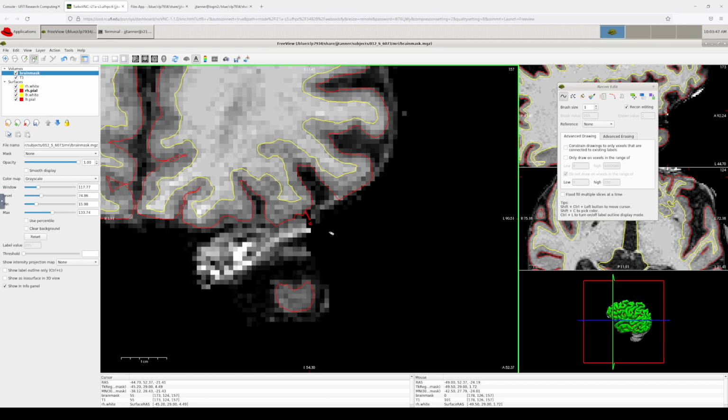And so FreeSurfer won't try to extend the cortical surface out there. So I think that was it for that slice. While I'm here, I'm actually just going to delete a few voxels right here. Those are ones that were going out through the meninges as well. If you can't see that, don't worry about it. Again, this is just to get some more experience.